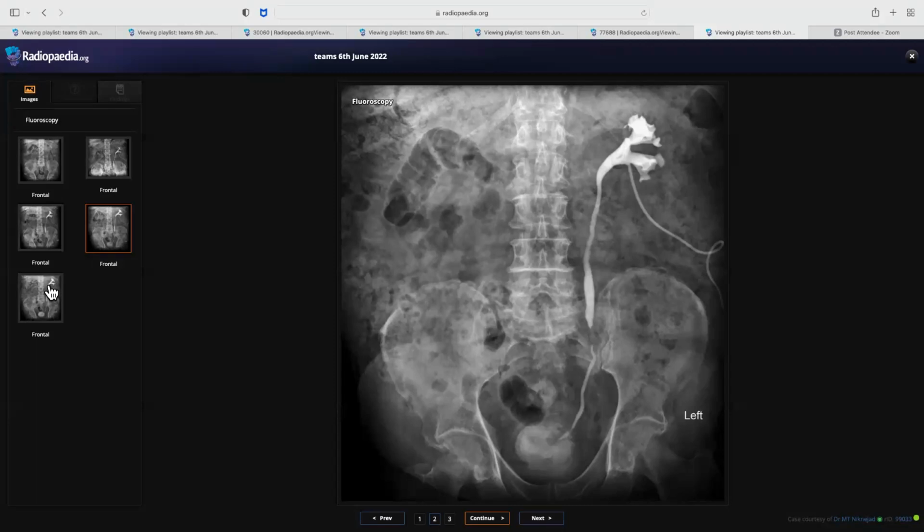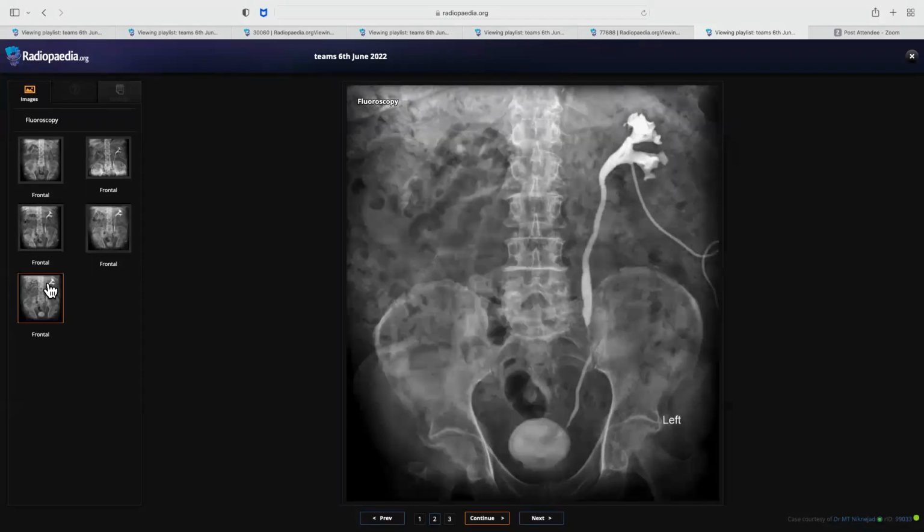So in summary, I cannot see the right kidney or right pelvicalyceal system, and there are maybe sclerotic changes or osseous lesions in the pelvic bones, and the left pelvicalyceal system is adequately drained. Still mild residual dilatation in the proximal ureter, and there is a filling defect around the distal left ureter, suggestive of an intravesical lesion. So I will convey the findings to the referring physician and correlate with any clinical history and ultrasound examination for the bladder to assess the possibility of a lesion and check the condition of the right kidney.